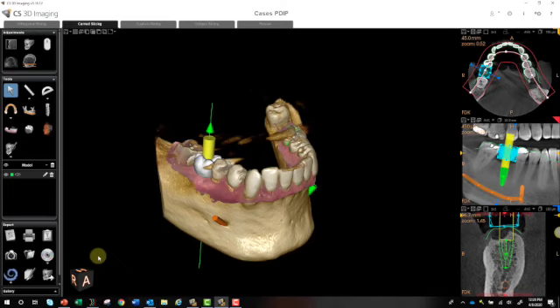If you wanted to design it yourself, you've got your Blue Sky planning software right here, so I can do a single click that'll launch Blue Sky planning software with your full plan attached. Something to note, the Blue Sky icon will only show up if you have Blue Sky planning software installed and you have the PDIP module. And then you can design your own guide, export, and print.